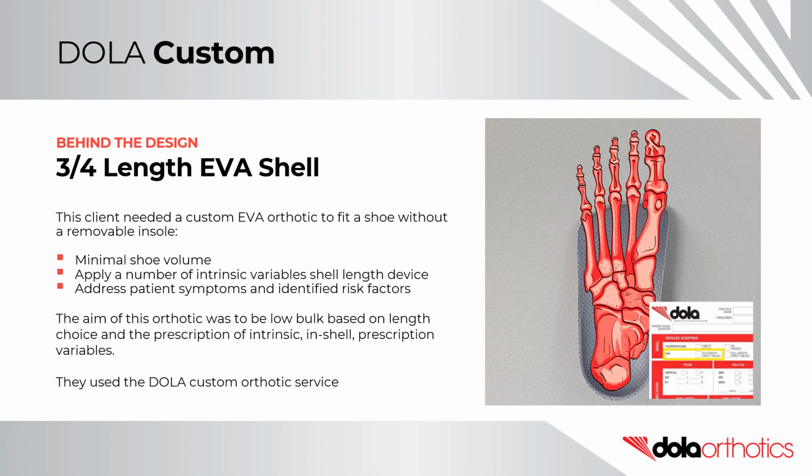Behind the design, 3/4 length EVA shell. This client needed a custom EVA orthotic to fit a shoe without a removable insole. It therefore required to take up minimal shoe volume, while still applying a number of intrinsic variables to the shell length device to address the patient's symptoms and identified risk factors.